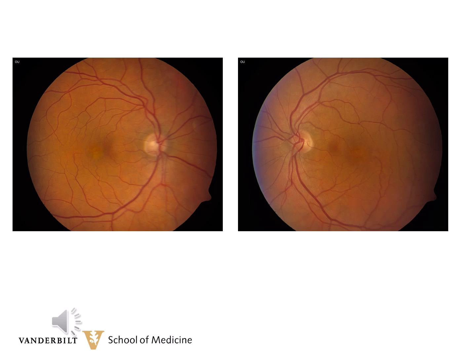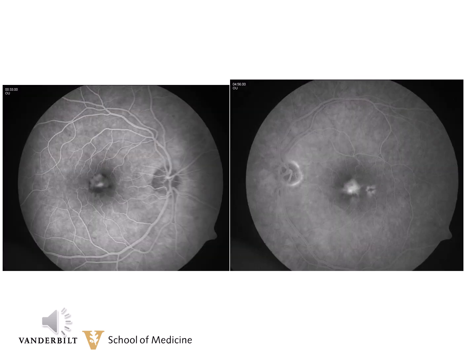He's a 70-year-old gentleman with vision of 20/30 in each eye. As you can see clinically, there's a decreased foveal reflex, but the macula is otherwise normal. Here, the fluorescein angiogram shows the hyperfluorescent area in each eye. No drusen are clinically visible or visible on the fluorescein angiogram. Now, in this particular case, this hyperfluorescent center could have you worry about a neovascular membrane, so we'll have to get an OCT to see if that is the case.